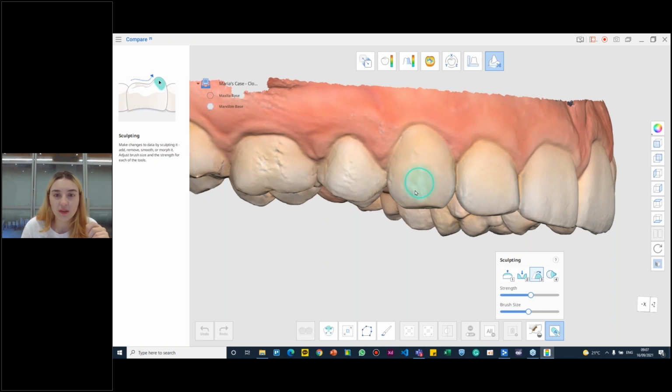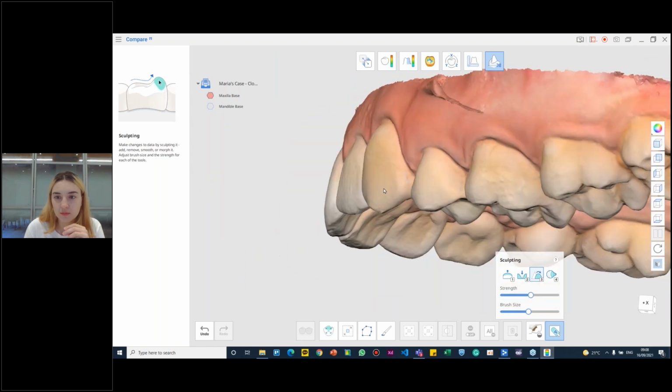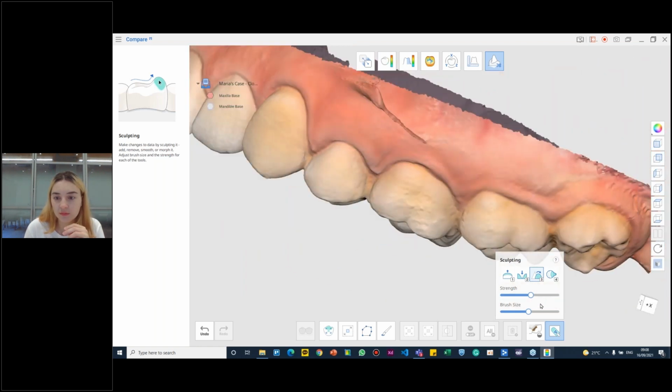Because we're doing this in real life and I'm sharing my screen, it's a little bit slower, actually much slower than usual. When you try it yourself, you will see that it's much, much faster. Maria, earlier when we were talking, you mentioned that this is smoothing out irregularities on a model, but to be careful really on a prep. We're talking to people in the dental industry who are aware of this, but the concept is really cool that you can make slight adjustments or really heavy adjustments, like what you showed me earlier. So it's a really cool new tool added.